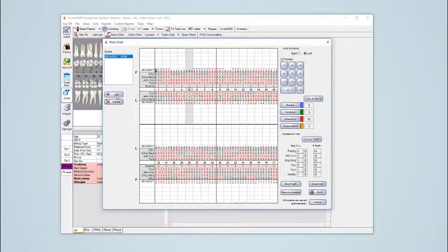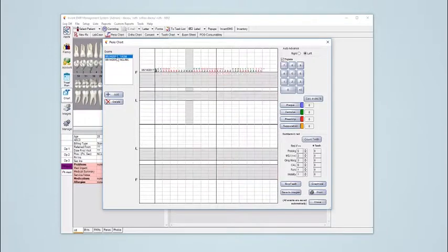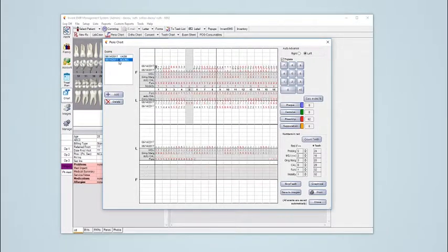If you want to add another exam, you basically do the same process, but the idea is you will be able to compare the numbers and the readings, and you can go through the whole process all over again. And if I click on the first examination, it will show me the differences between the two readings.